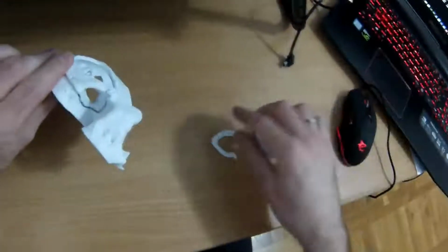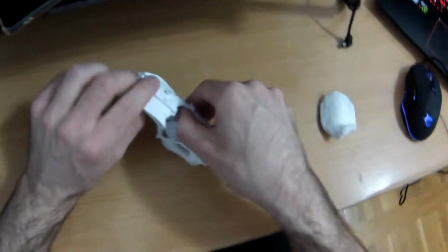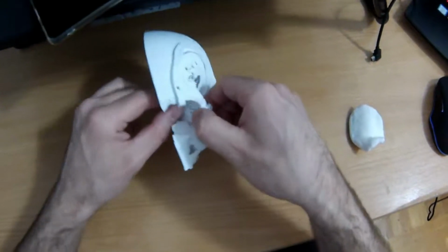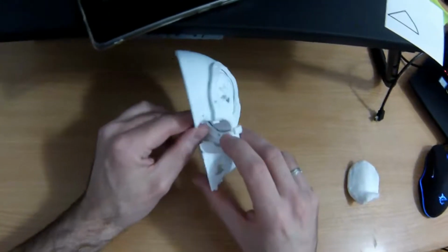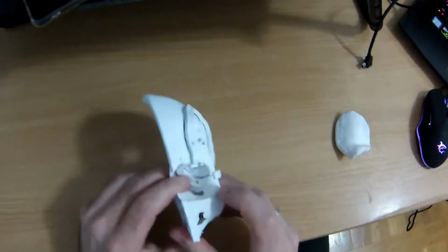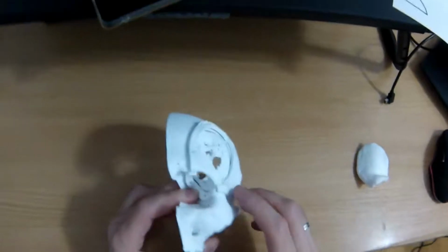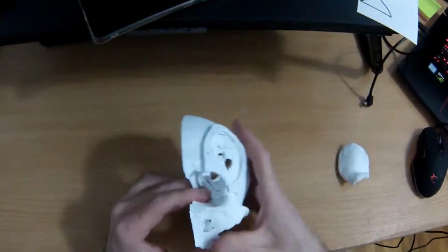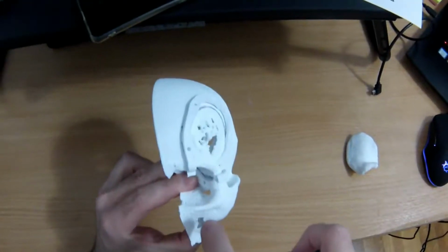The only thing that crossed my mind, and I told them, is that maybe I should change the angle of the screw hole where the orbital part of the cutting guide will be fixed, so it will be hard for the surgeon to fix it at this angle.